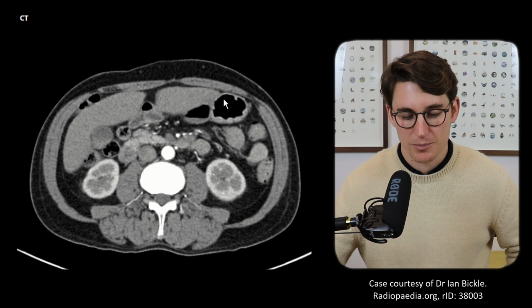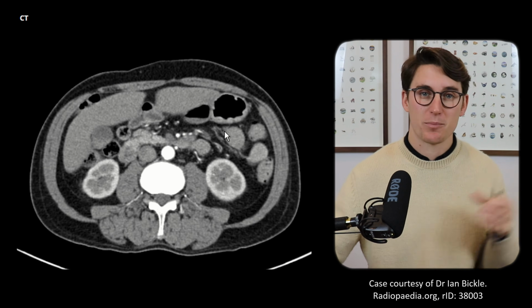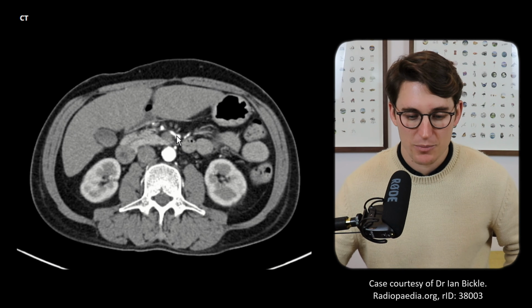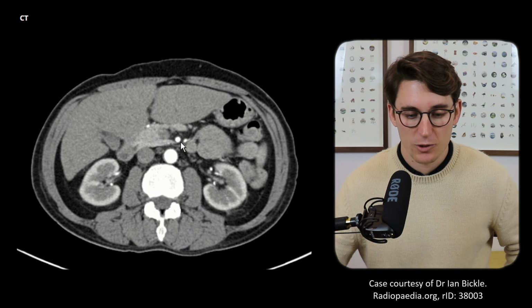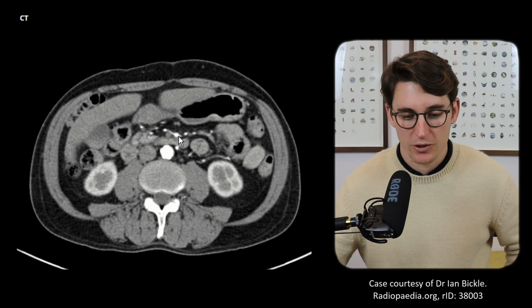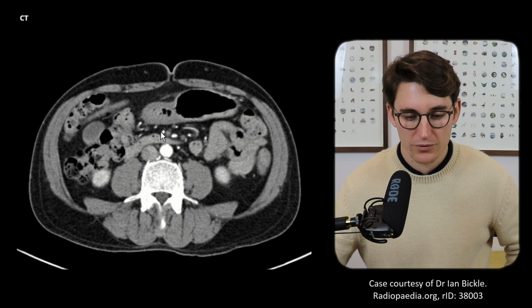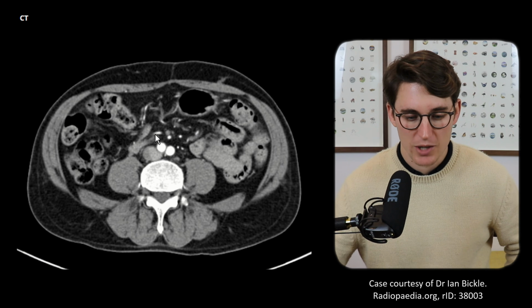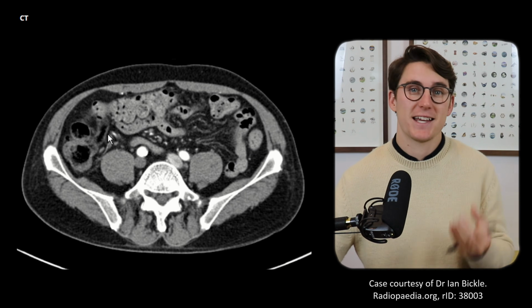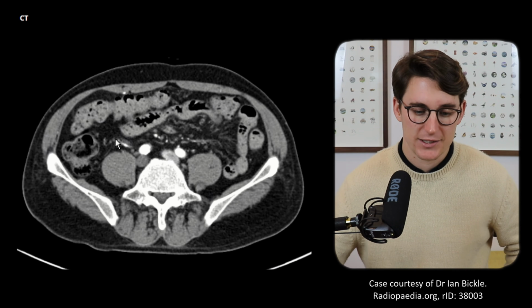Follow that branch. We can see that it's supplying the transverse colon there. It's supplying the proximal 2/3 of the transverse colon. So we can see that branch there. Let's head a little bit more inferiorly, and we should see our right colic artery coming off. There's our right colic. We can follow it along. Let's see, it should jump across to the right. There we go. And it's supplying our ascending colon on the right-hand side of the patient there.